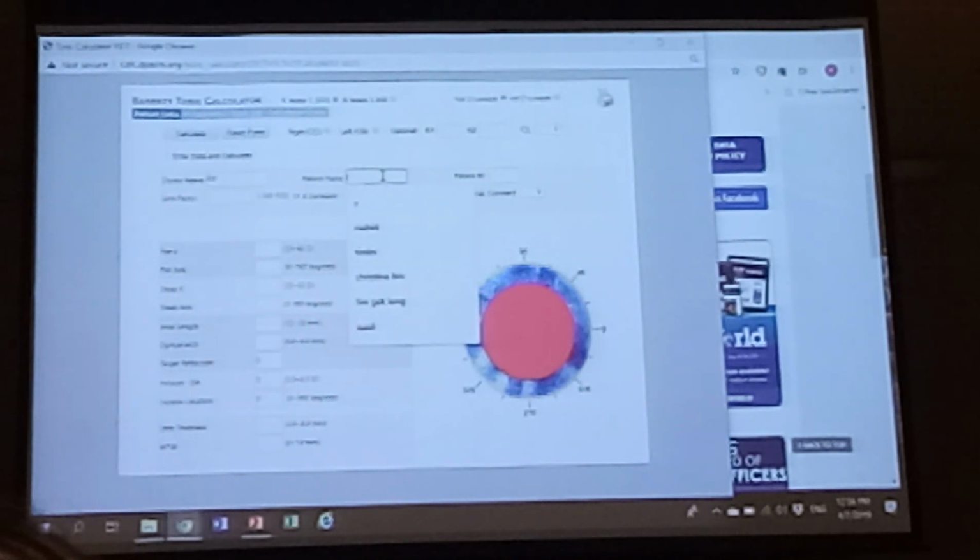Have you all managed to input the three sets of K data? Yes. Okay then, can you press the calculate button and you should see that box on the top right fill in. Then what you do is press patient data, top left. It brings you back to the first page. From there you press calculate again. When you press calculate again, it's brought that integrated K together with the axial length.